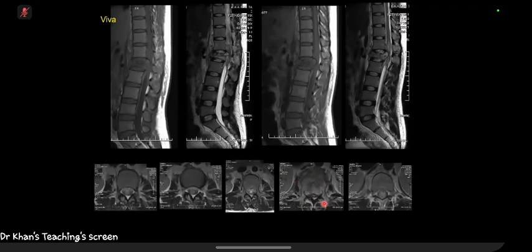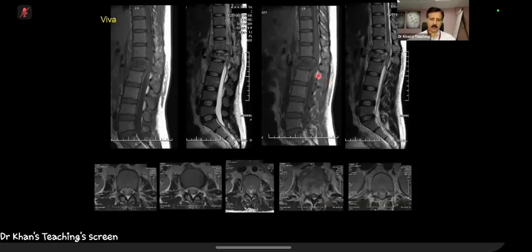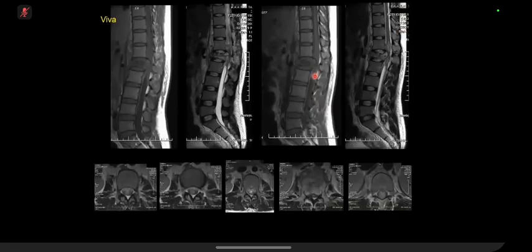So I can see there is an abnormal cortical bulge posteriorly, and there is also complete effacement of the spinal canal with cord compression at this level. Okay, and what is happening here? Anterior to my mouse, in between the mouse and the vertebral bodies. In between your mouse and the vertebral body.